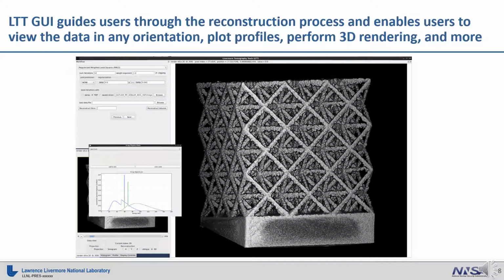It also comes with full help menus. If you hover over any parameter, it'll tell you what it means. Then you have long descriptions of every algorithm telling you exactly what you're doing. So there are no black boxes here. Everybody gets to know exactly what's going on. And it was really developed in, I would say, a professional software manner.